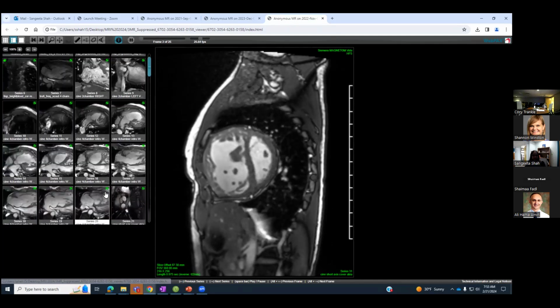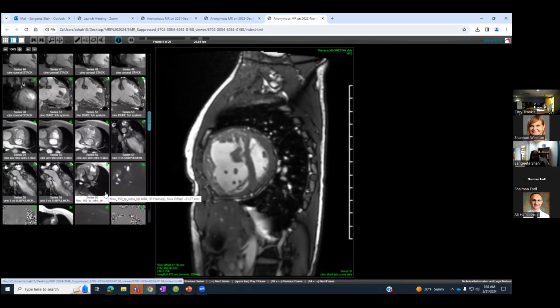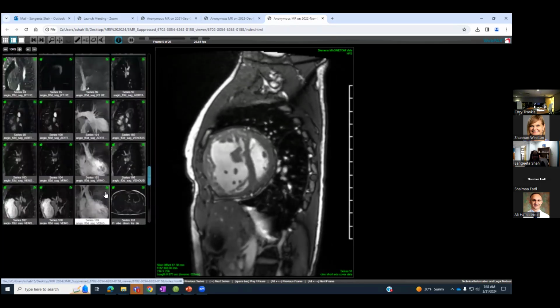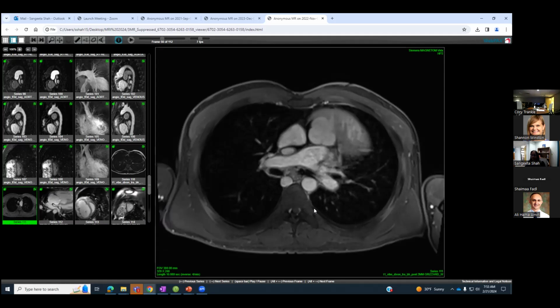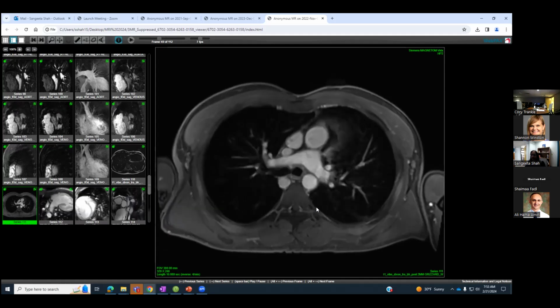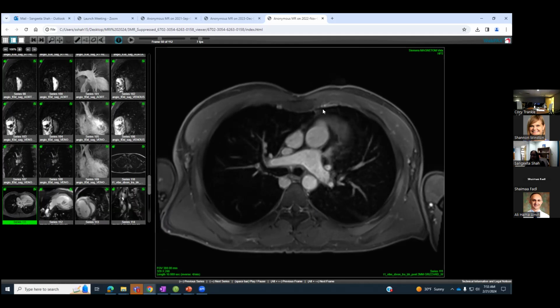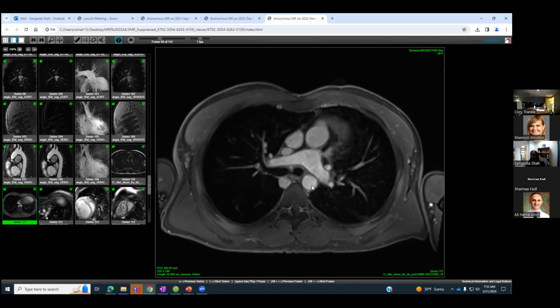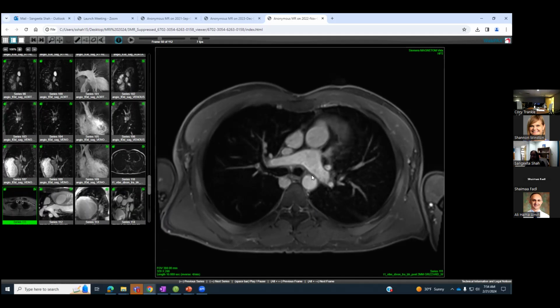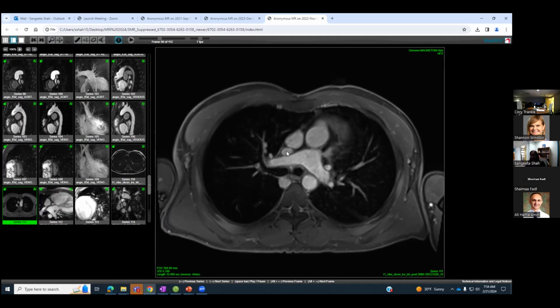All right, I'm going to start at the top. So once again, the aorta is anterior. This is the PA with the right PA, left PA. This is the aorta. We have a new circle showing up right here.